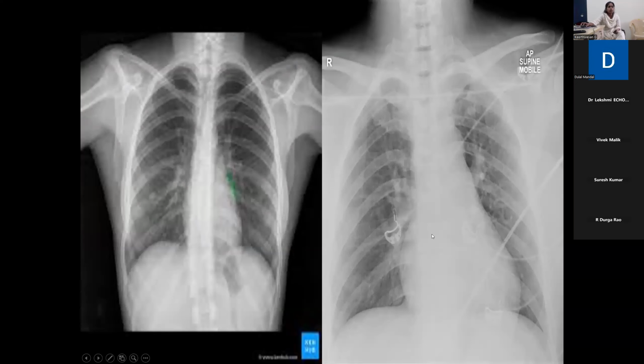So these are two X-rays. This is the PA view and this is the AP view. See, can you see the scapula here? No, but the scapula here is very well visualized in an AP view because the shoulders are not rotated, so we are able to see the scapula. What about the clavicles? The clavicles are right over the lung field, but here you see the clavicles are projected towards the apex of the lungs. Can you see?